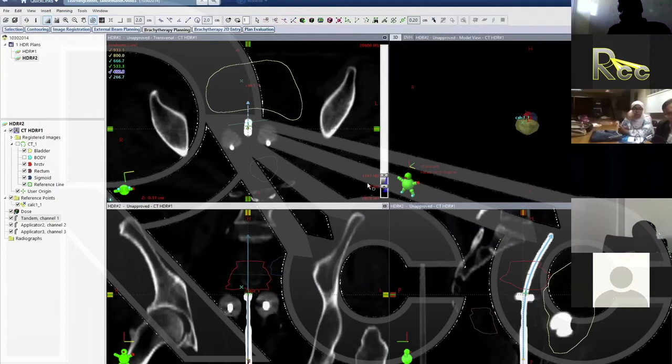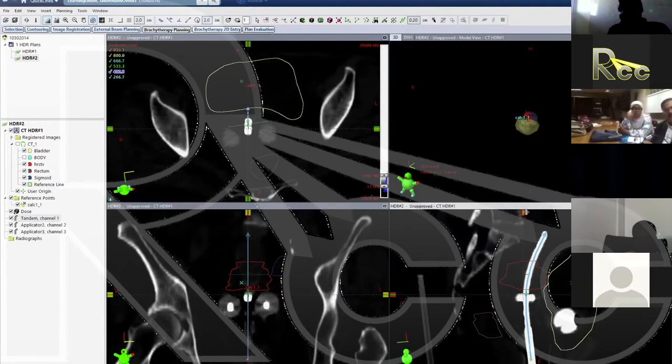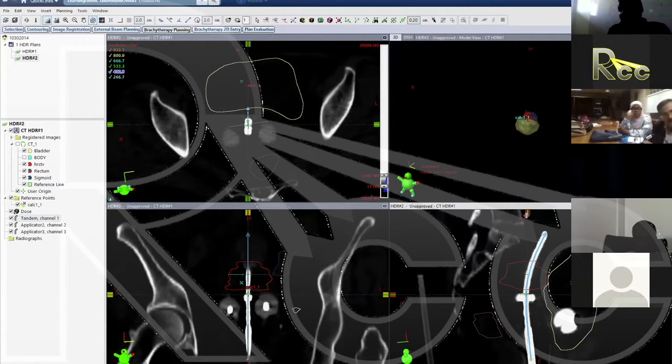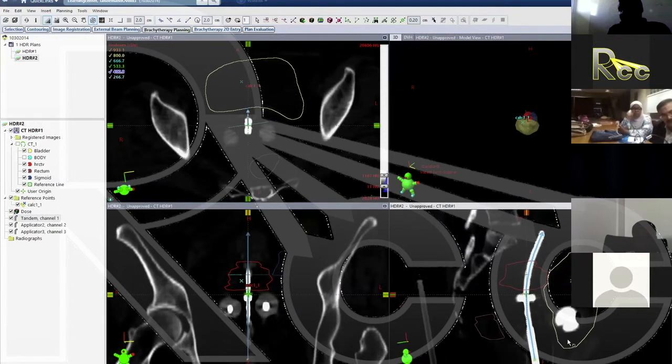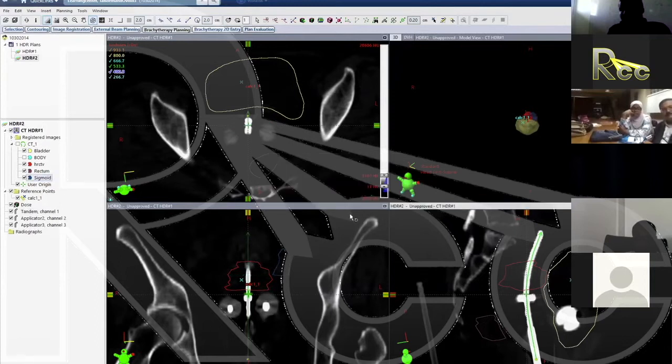It's in line with the tandem, and I'm going to rotate the tandem, move this axis over, so that when I go 2 centimeters up from the flange, I'm still going to be in the tandem. I'm going to rotate that a little bit. And we already have one in here. I'm just going to delete that and recreate it so we're not cheating at all here.